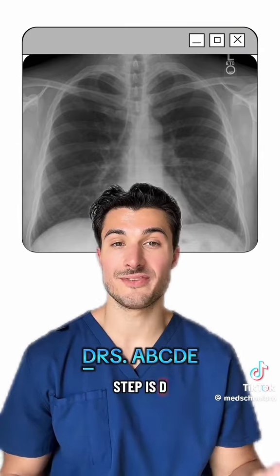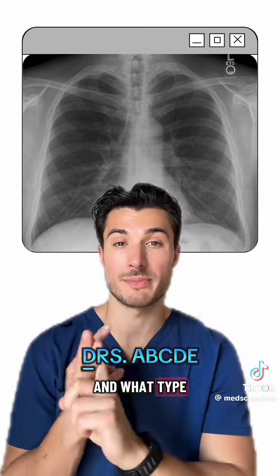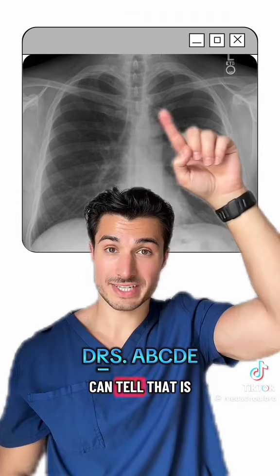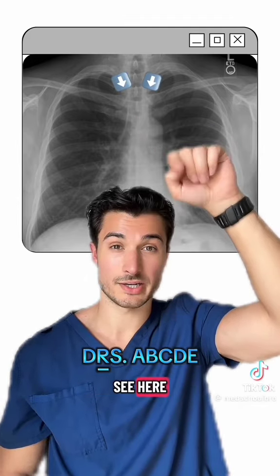All right, so first up is D for details. Really, you're just making sure, is this the right patient? What's the date and what type of film is this? Next up, R, which stands for RIPE. R for rotation. The way you can tell that is look for equal distances between the clavicular heads and the spinous process, which we see here.